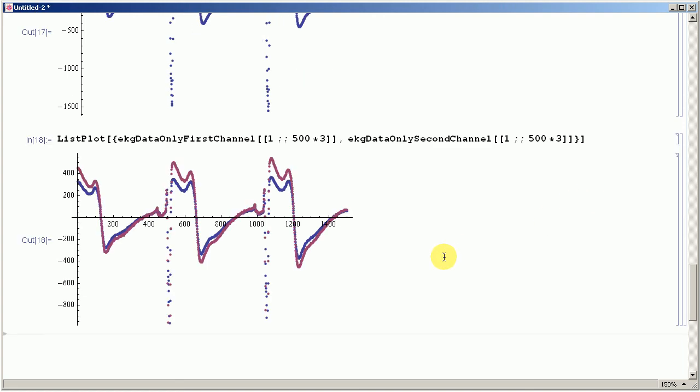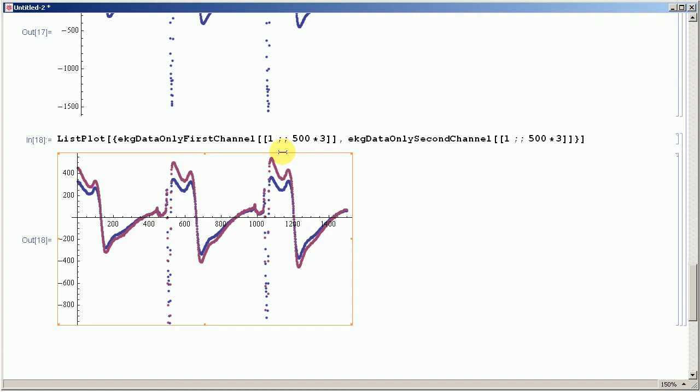Notice that this is not the heartbeat that you hear, boom, boom. It's not. This is the electrical signal from the heart, taken from 2 points on the body. I do not know where they were, and I do not know what to do with this yet, but I will let you know as soon as I find out from the doctor. Along the timeline, this is going to get faster, I think, because these were measured right after the drug infusion. So the drug is affecting the heart rate, and you can measure how quickly it was beating just by seeing where the peaks are. As you can see here, it was too much to show the entire length.